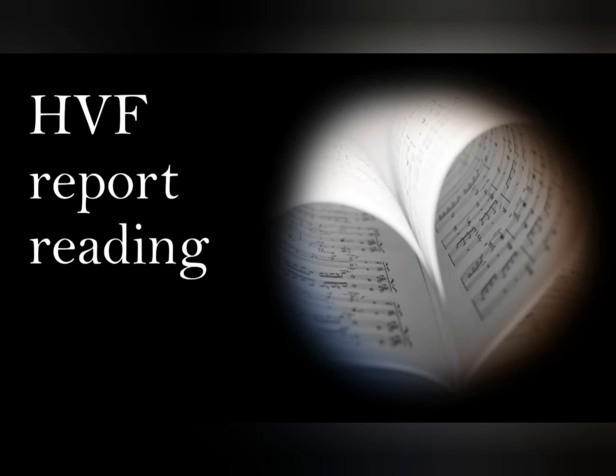Today in this video you will get to know how to read the HVF report properly. What is HVF? HVF stands for Humphrey Visual Field Analyzer. It is a machine that is used to measure the visual field. HVF is a static procedure to measure the visual field, where there is a fixed target and the background illumination is constant, but a stimulus of variable intensity is projected all over the patient's visual field to assess the visual field and also to see the sensitivity of the retina.